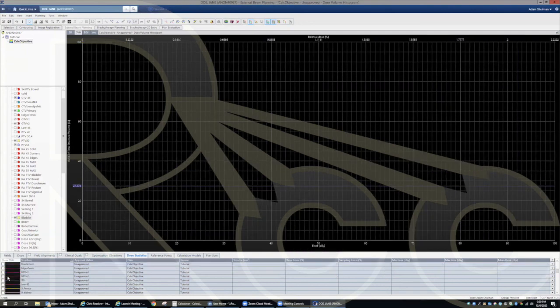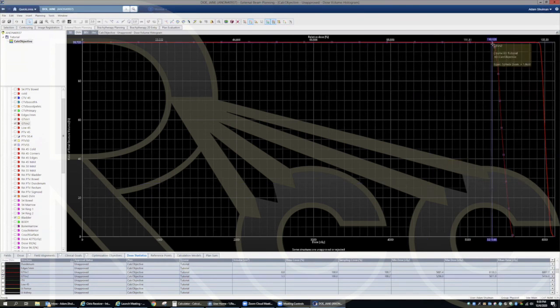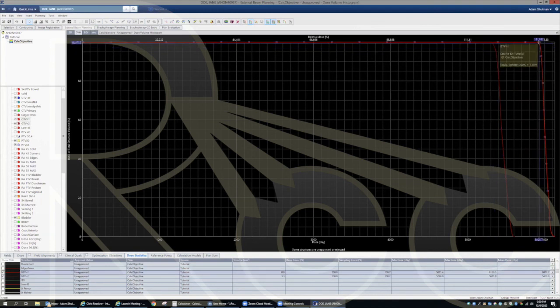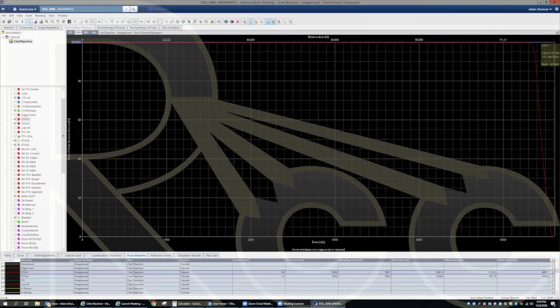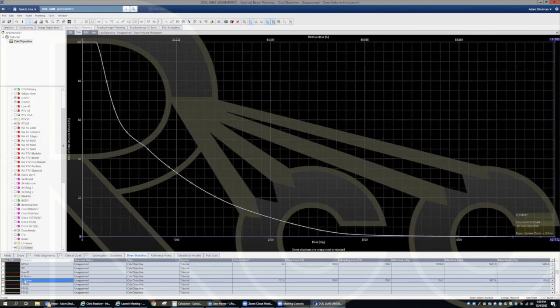Let me just pull up these GTVs. This one, 7% hotspot, 97% coverage. This 7% hotspot is 100% coverage. So we did 5 different dose levels in this plan, even though some of them were pretty small. Here's the kidney dose, the mean of 8 gray.